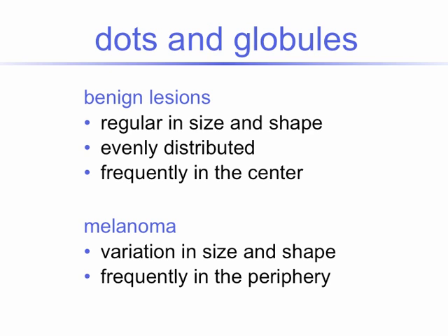Here's an example of a basal cell carcinoma with non-aggregated globules. The arrows point to a concentric globule, which is considered a variant of a spoke-wheel-like area. Although dots and globules can be seen in melanocytic and non-melanocytic lesions, their morphology and the other structures present within a lesion can usually help correctly classify the lesion as a melanocytic or non-melanocytic tumor.